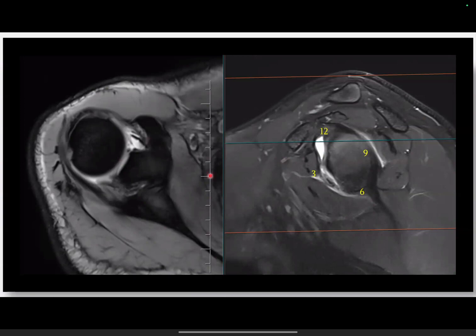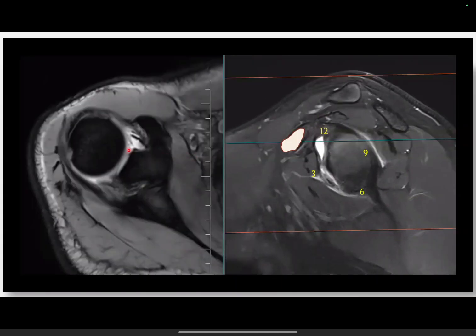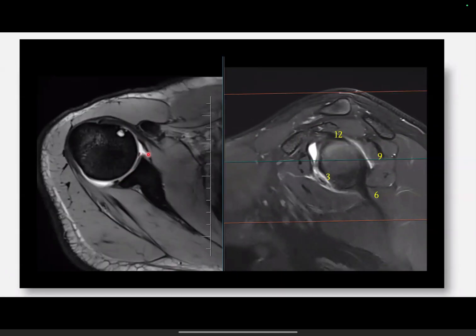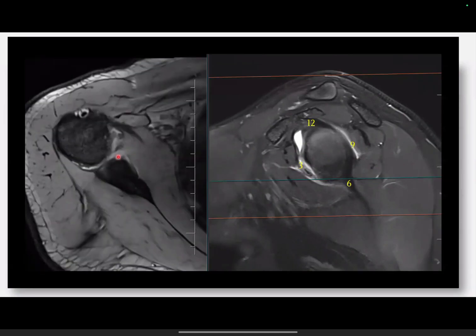So this is another example of labral tear. You can see this is a recurrent shoulder dislocation case. In that you can see from 1 o'clock position the anterior glenoid labrum is not there. So there is an anterior glenoid labrum tear, and there is a capsular tear, and the adjacent periosteum is also stripped off or elevated. I'm not discussing today those eponyms of labral tear like ALPSA, POLPSA, Perthes and all, because there is no requirement of giving these types of names in the report. Just describe the findings and leave it.